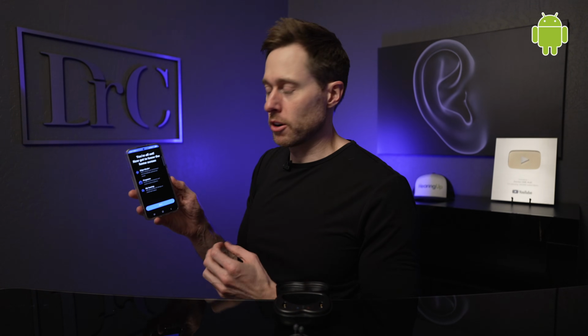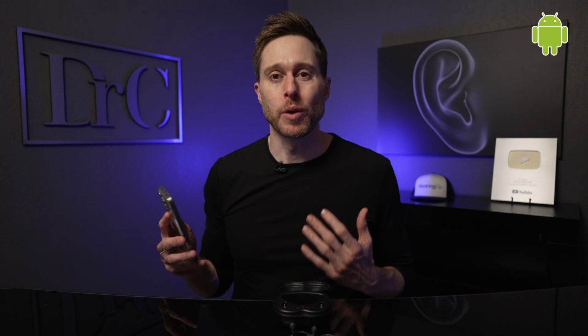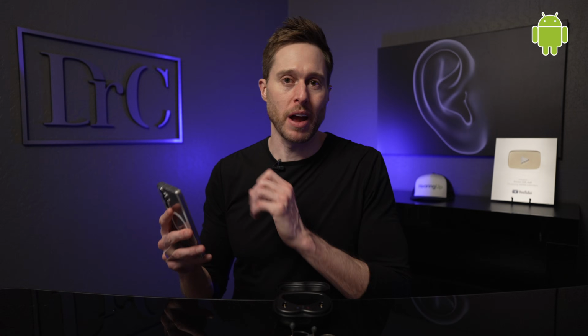All right, there we go. It's identified my hearing aids. So I'm going to check both of those boxes and click on connect. There we go. I'm going to pair with the first one. Come on, buddy. You can do it. Oh, it's a miracle. We got them connected to my Samsung phone. And there we go. We now have our Starkey hearing aids connected with our Android phone.